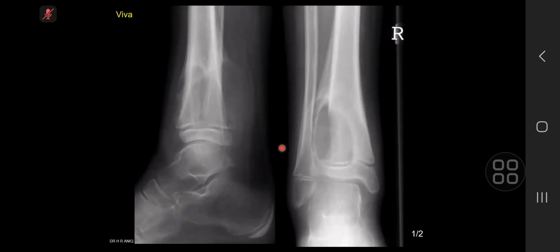but the features associated are quite that of an aggressive lesion, so it has a wide zone of transition, I'd say. My differentials in a child of this age would include an Ewing's, that would also include lymphoma, even though the bone matrix does not look as permeative here, but I'd consider an aggressive bone lesion here.